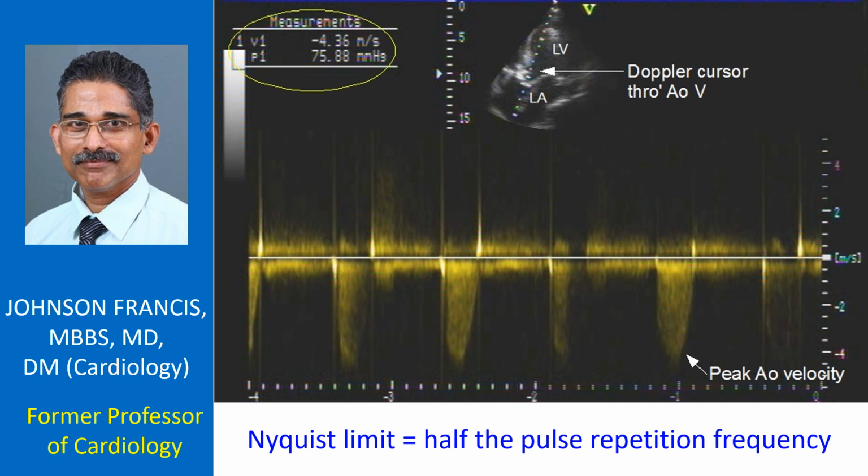The small figure above shows the line of the CW Doppler cursor passing through the aortic valve. The lower portion shows the tongue-shaped Doppler signal due to systolic flow in the aorta just beyond the aortic valve at high velocity. The scale at the bottom represents the time axis and the vertical scale represents the velocity in meters per second. The scale beside the 2D image at the top gives the depth in centimeters.